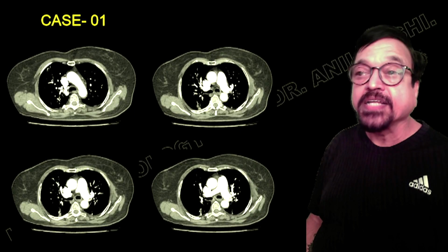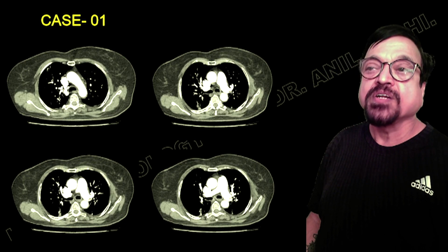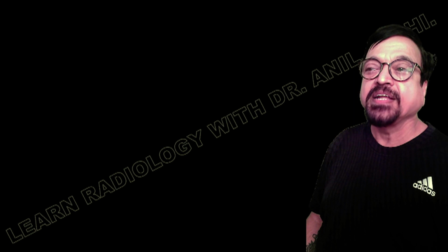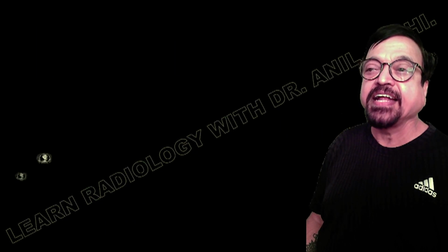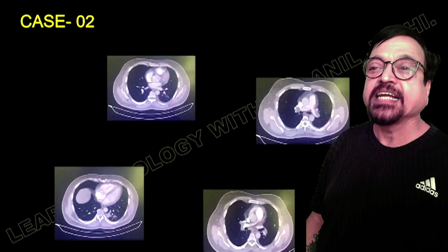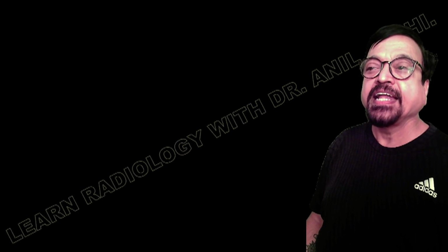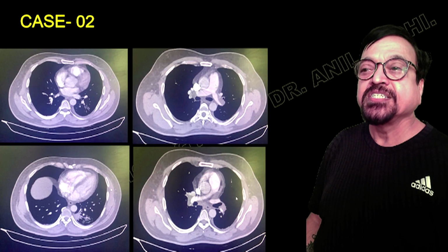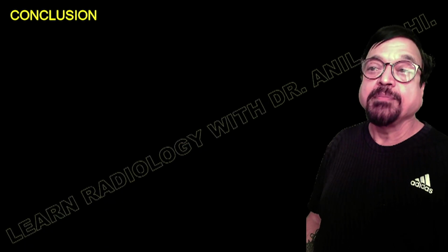Now these are the two cases we are showing you. In addition to what was shown earlier, here we are seeing a contrast enhanced pulmonary angiography. You will find here the crescentic filling defects, which indicate that there is pulmonary arterial thrombosis. Now this is the second case. Again we are seeing contrast enhanced CT, and you are finding there is a filling defect which is indicating pulmonary arterial embolization. With that we are coming to the end of the lecture.